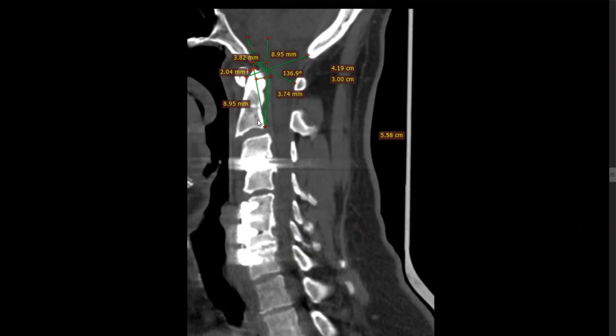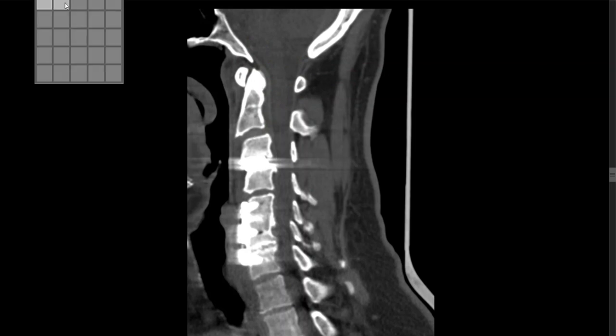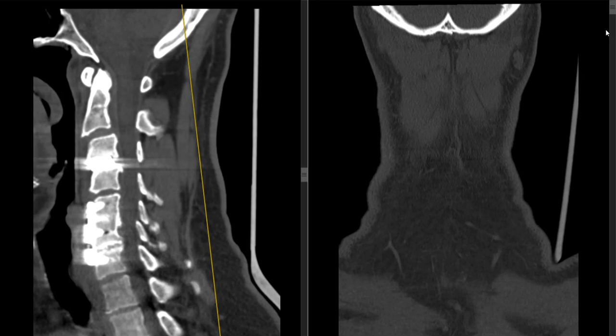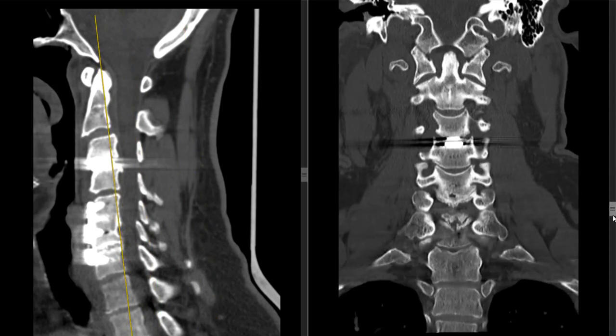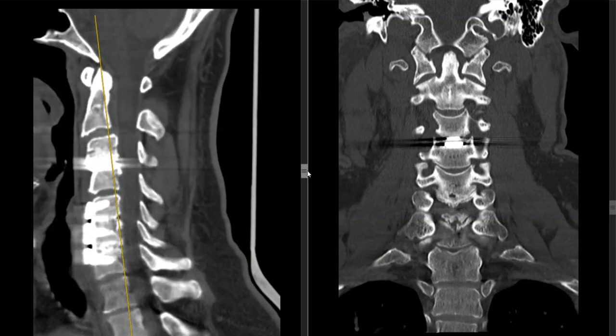Okay, moving on, I'm going to get rid of all these numbers here. It will let me. Shift delete. All right, so we're going to now take a look at the side facet joints, which I can show you where I'm actually looking, if you have a coronal view. No, yes you do. All right, so we're going to come in here, and you can already see rotation right here. You can see the difference of deviation, which I already suspected, that something was rotated.